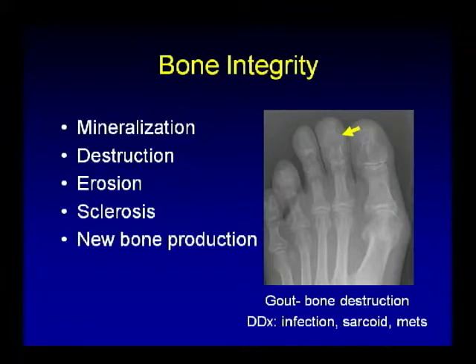And very dense sclerosis might suggest osteoarthritis, neuropathic, or some sort of inflammatory arthropathy that's been around for a while and is turning into a secondary degenerative change. We'll also see lots of types of erosions throughout this talk, and we want to look for those, and that just means that you don't have osteoarthritis for sure, and usually not neuropathic either, usually not lupus.